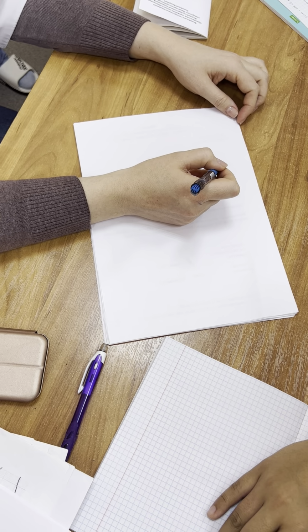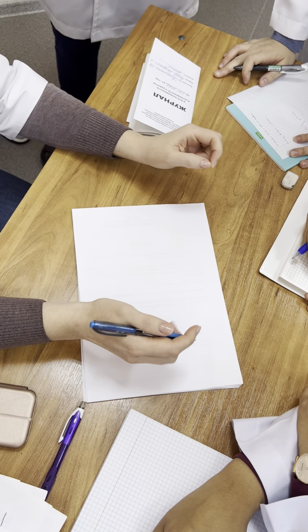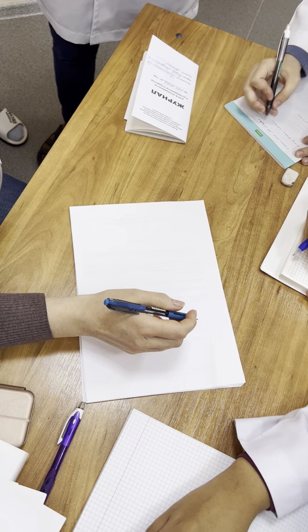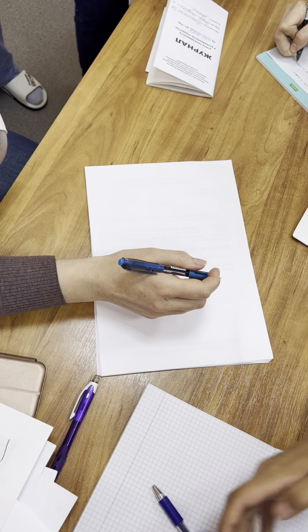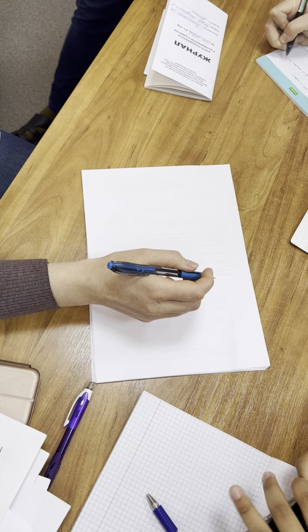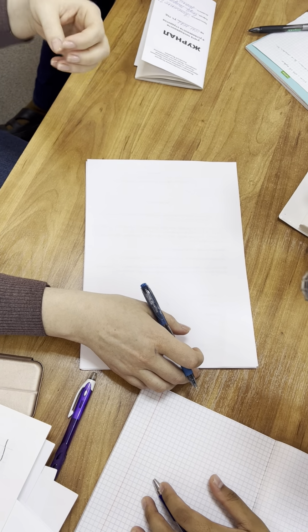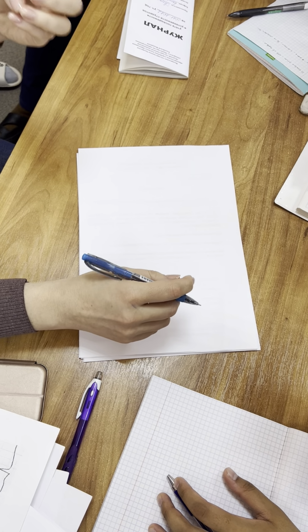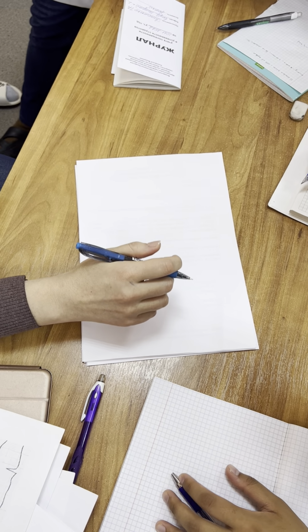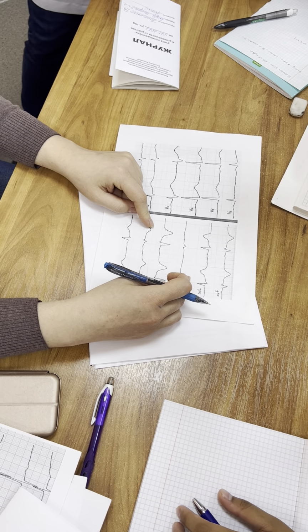First of all, location, such as one of the characteristics of the MI, its location. We have 12 leads in ECG. By these ECG changes, by these leads, we can tell what wall is affected. And next, you ought to understand by this wall. You will see, as an example, here we have inferior location of MI.